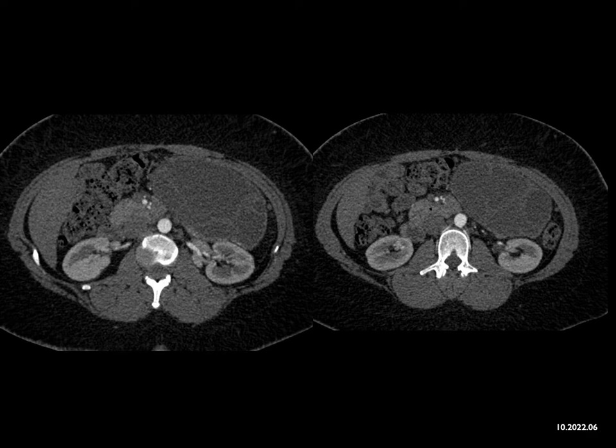SPEN tumors, the age is not good. They can be cystic, but they're usually more cystic and solid. So this would be an atypical SPEN, and the age is not good. Serous cystadenomas, they're a thought. You can get septations, but this is not quite so much septations as much as these linear lines. But I have to admit, I couldn't exclude it, though the age is not that good.